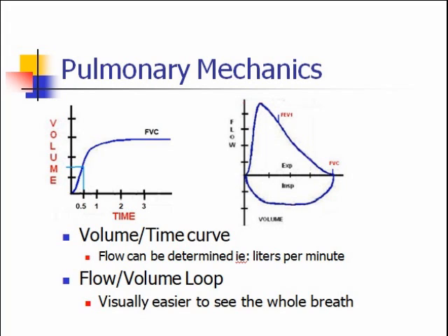The volume time curve gives us the ability to measure flow rates, which are liters per second, then calculated into liters per minute.